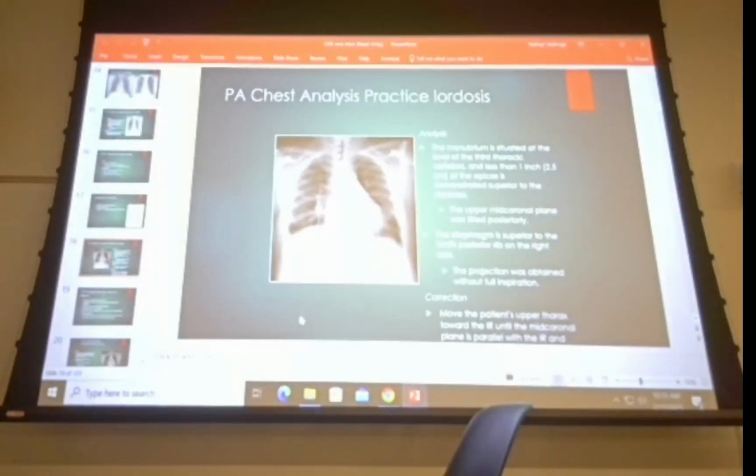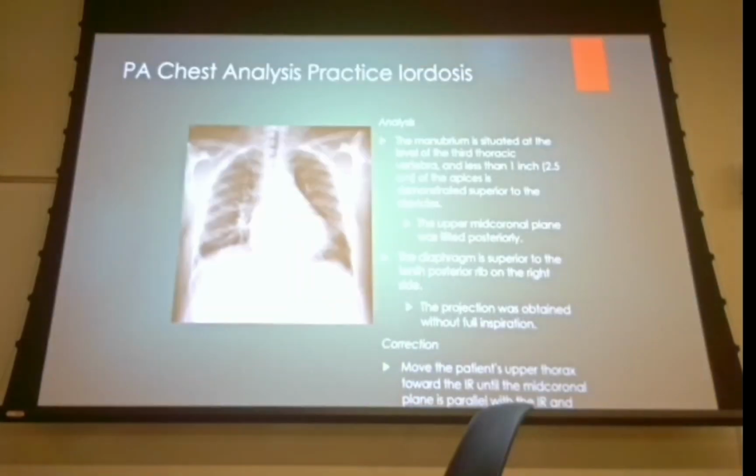So enlarge that so you can see a little bit better. It's open in my office, so I cannot enlarge that. Okay, but you can kind of see that, right? You got 1, 2, and then you've got these flat clavicles, and the apex of the lungs are covered up.